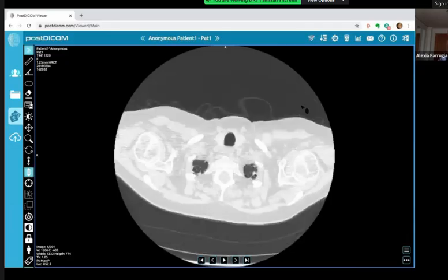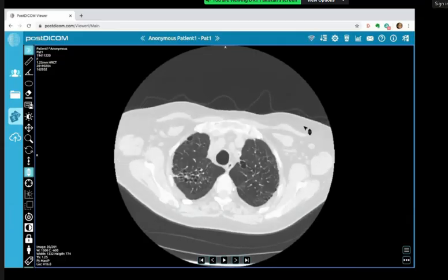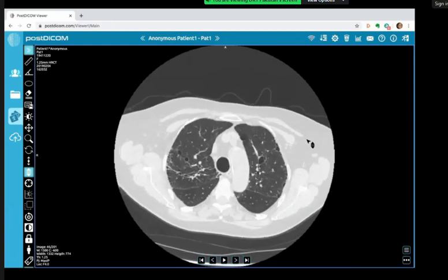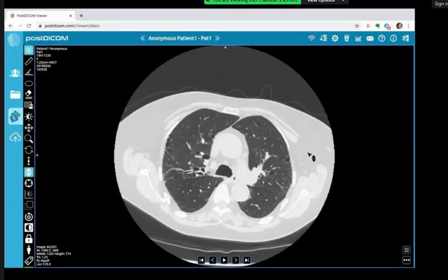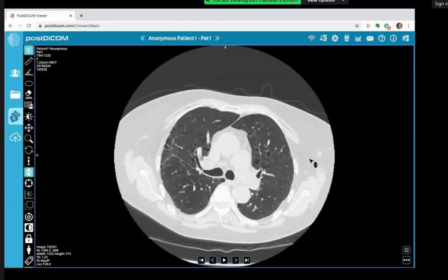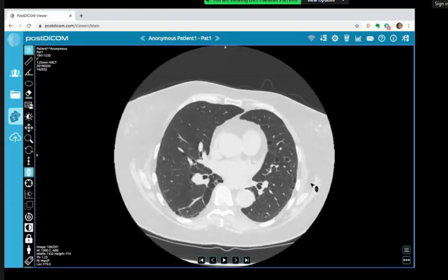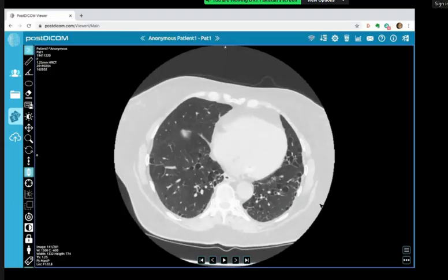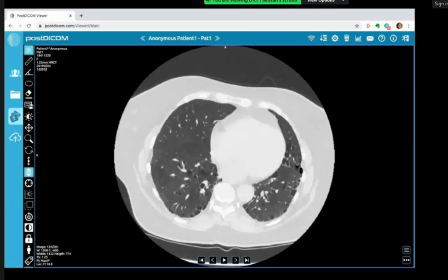Okay. Do you think you have seen the abnormality? So I can see that there are bilateral cystic areas in a fairly random distribution, but if anything, more along the subpleural surface, but they are randomly scattered throughout all lobes in both lungs. And the lung bases in particular, there's quite a few almost coalescing, like in that inferior lingula, coalescing cystic areas.